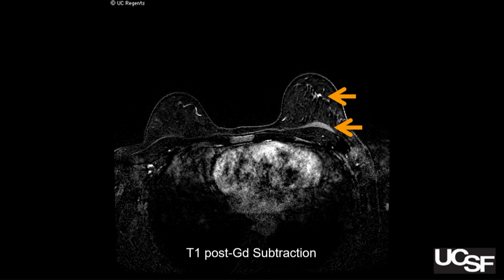But look there. Remember on Sunday, I said, if you have this banana-shaped, crescent-shaped thing at the level of the pectoral muscle, ask yourself, did something happen? Did the patient move between the pre and the post? Did she flex her muscle? Because if she did, then the breast tissue might also have shifted. And if you shift tissue into fat, you're going to get pseudo-enhancement, misregistration artifact.